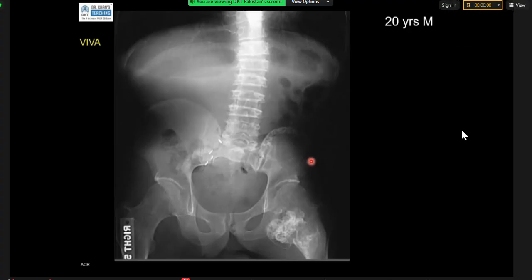Okay, so I will also compare with the previous images to see if this was present before or not. I will suspect congenital anomalies or congenital disease such as polio if it is present in the previous images. Nothing like that.